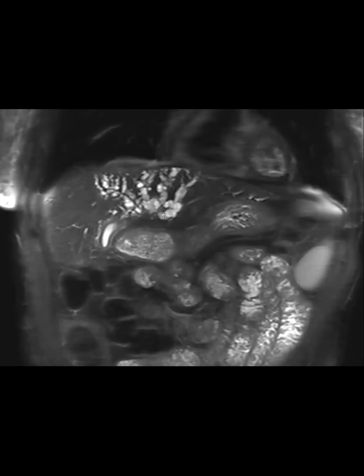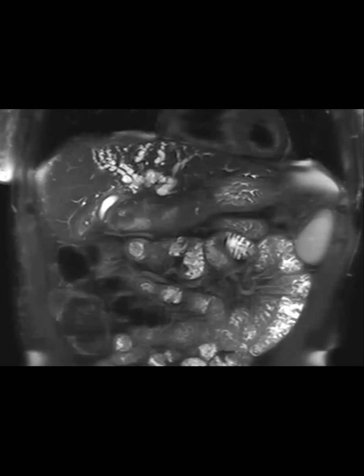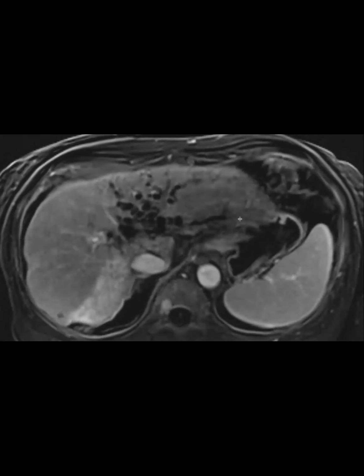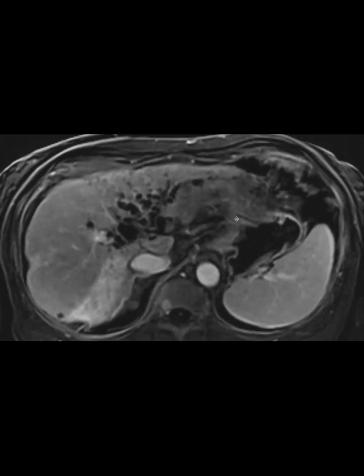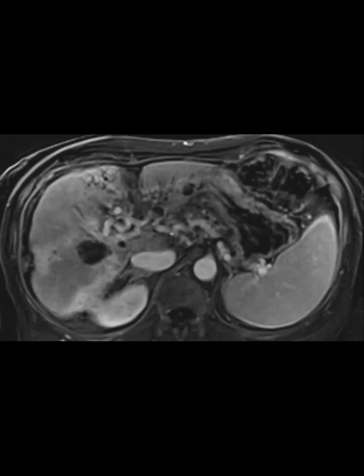Can you see any of the papillary stuff, or are you mostly just seeing the mucin? There are some T2 hypointense areas here. On Spyglass, they didn't record seeing papillomatosis or papillary growth. And on the post-contrast, we don't see any enhancing components. Sometimes, you know how you see polypoid enhancing tissue within IPNB? We don't really see any enhancing tissue there.